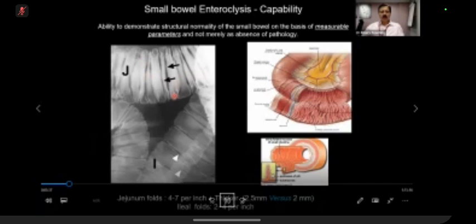Do you think this is malignant or benign? Candidate 8: The stricture appears to be short segment and irregular with some shouldering as well. And if the patient is a known celiac disease, I would suspect it to be malignant as well until and unless ruled out, because it has more association with lymphoma or carcinomas of the bowel.